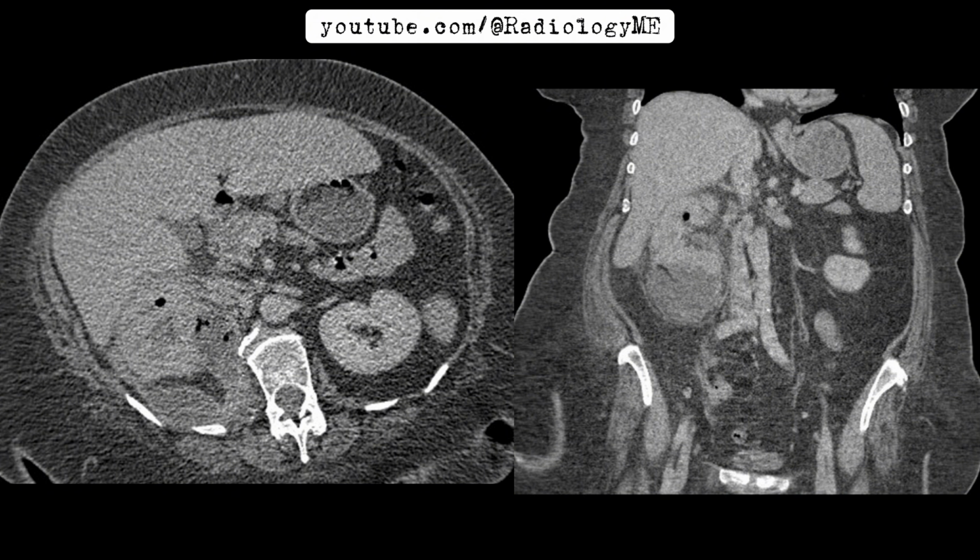Let's also highlight an additional case involving obstructive pyelonephritis, where a patient presented with bilateral staghorn calculi leading to urinary sepsis. Imaging revealed a large calculus obstructing the renal pelvis, which resulted in severe hydronephrosis. Despite full medical management in the ICU, the clinical course didn't improve, emphasizing how crucial early intervention and surgical management can be in such severe cases. Ultimately, timely diagnosis and management are critical in cases like these.